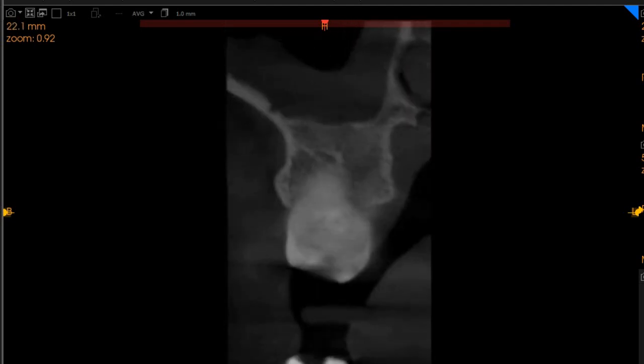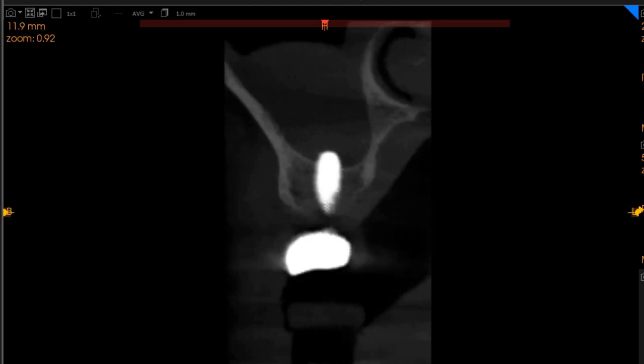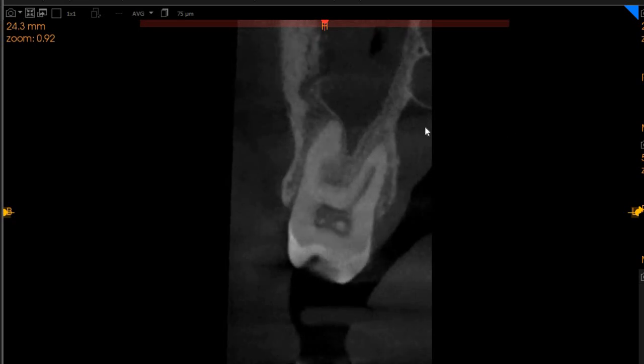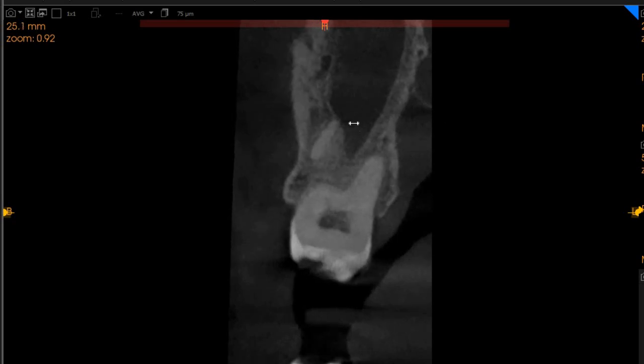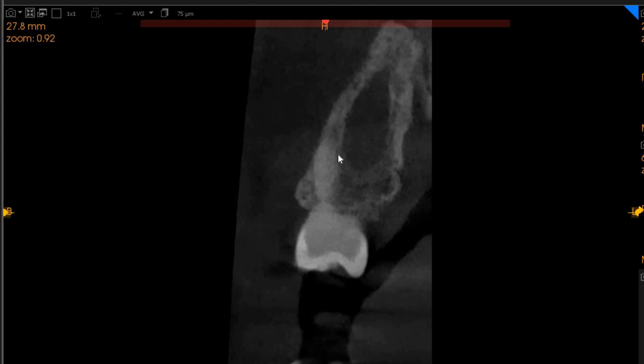Moving to the upper left segment, even though the doctor asks about upper left 6, the 6 looks okay, the implant looks perfectly fine. This is the upper left 7 region, and here you can see we've got the mesiobuccal root. The mesiobuccal root has two canals which join to form one. We've got a single palatal canal, and then we've got a single distobuccal canal as well. And the distobuccal root unfortunately is longer, has a periapical radiolucency.